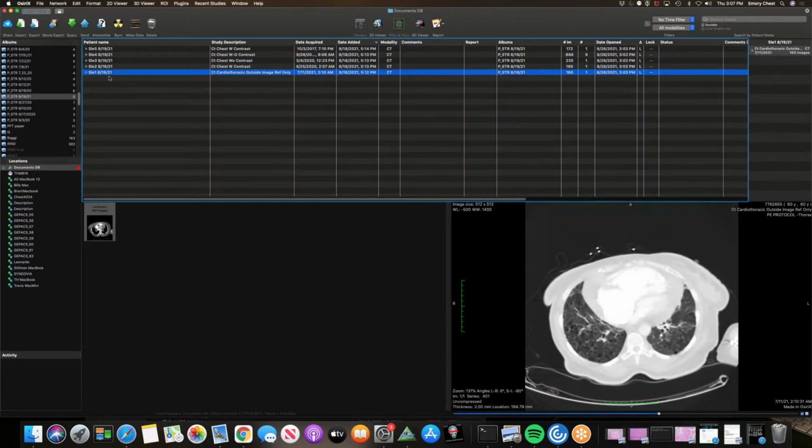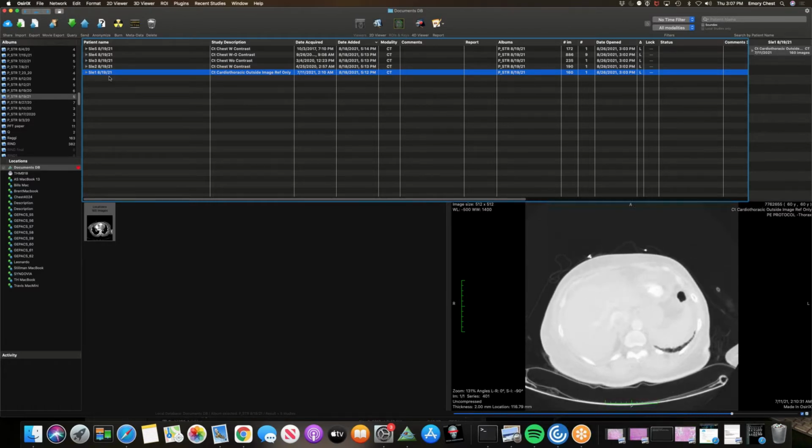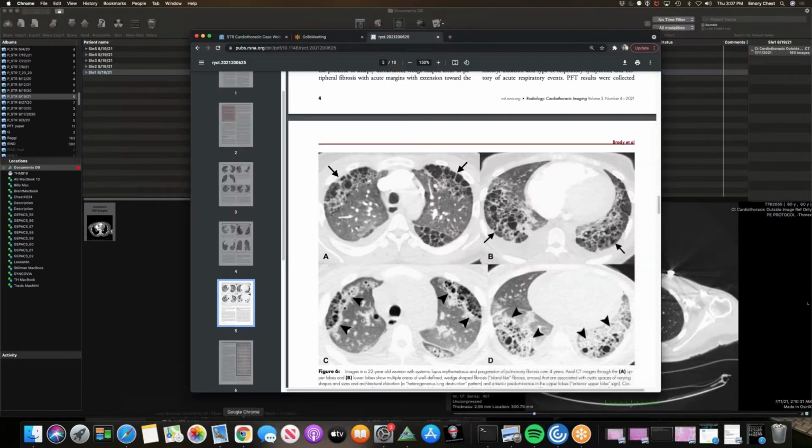Yeah, I don't know how much of that is honeycombing, and I'm always wondering how much of that is fibrosis. That was the issue with that paper. There was really no path proof of what this is. We do see some bizarre patterns with lupus. Is there any thought there may be some vascular injury, because many of the lupus patients get PE or they get antiphospholipid antibody syndrome, which would make it different than, say, the other connective tissue diseases? Because I don't see a lot of ILD with lupus, it's not that common.